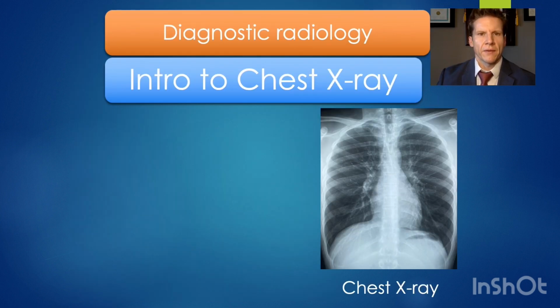Okay, so let's dive into our approach to the chest x-ray. Before we get started, the most important thing that I want to stress is that whether you're looking at a chest x-ray, a CT scan, or any other diagnostic exam, the most important thing is to find an approach that works for you, that you're comfortable with and familiar with, and stick to it, that you can do consistently and repeatedly so that you don't miss anything big or any subtle findings.